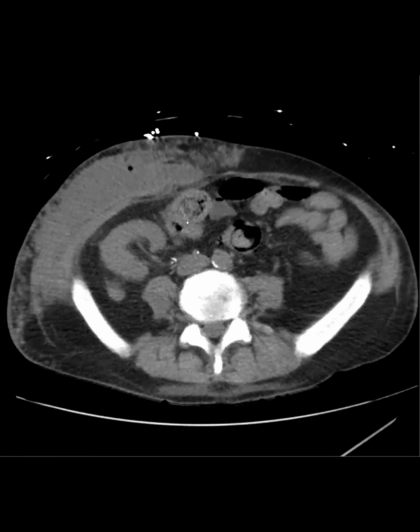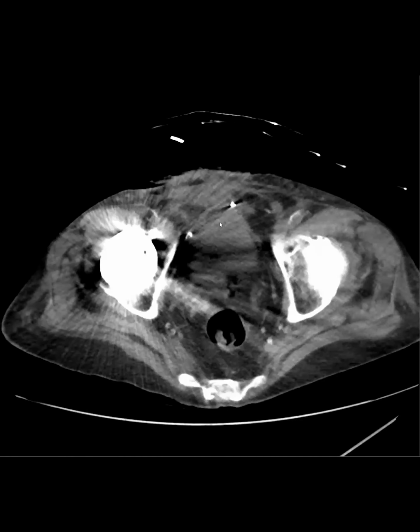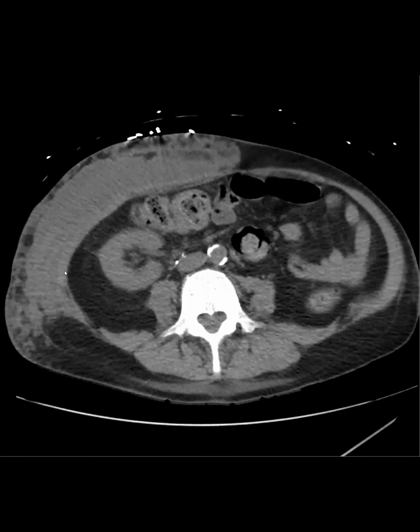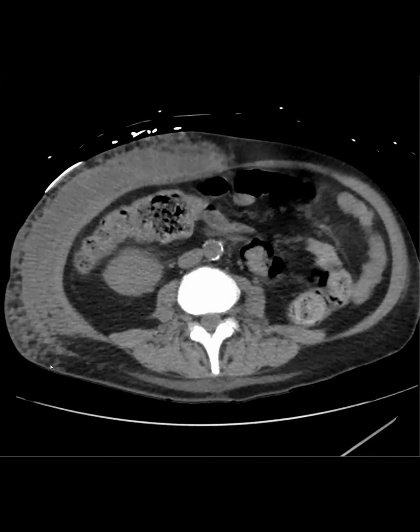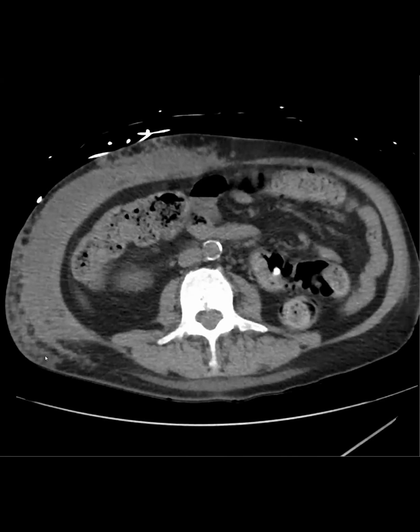Oh, cool. So yeah, this was basically a pancreas transplant connected to the bladder, which eventually caused a bladder cutaneous fistula and abdominal wall collection. One of the teaching points is if you ever see nodularity like this in your omentum, in your retroperitoneum, and now even in your subcutaneous tissues, think about saponification and fat necrosis from pancreatitis.